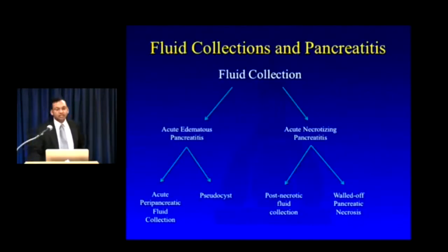So let's talk next about another category of complications, and that's fluid collections. All too often, we tend to be pretty imprecise when describing pancreatitis-related fluid collections. Everything's a fluid collection, loculated collection, abscess. We use all these terms that really mean something very different to us than they do to our referring colleagues, especially our colleagues in surgery and gastroenterology who deal with a lot of acute pancreatitis.